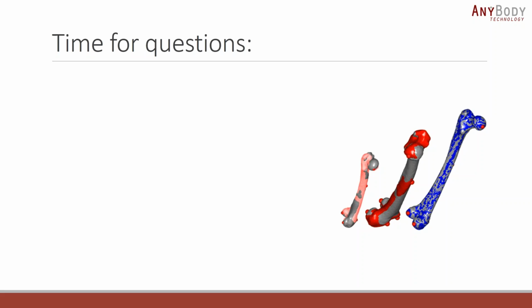For example, I wouldn't stop at the linear scaling, as I showed on the image that you see on the screen. For the left side, the error is still quite large, a few centimeters, which introduces a rather large error in the moment term. Because of that, I would still go with the nonlinear scaling. Normally, you can just assess it visually.